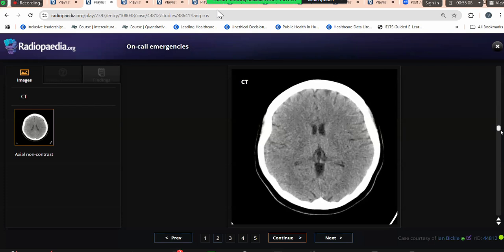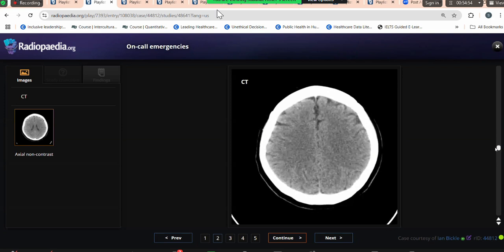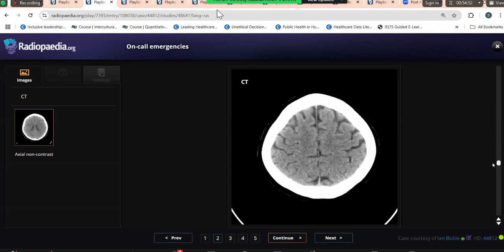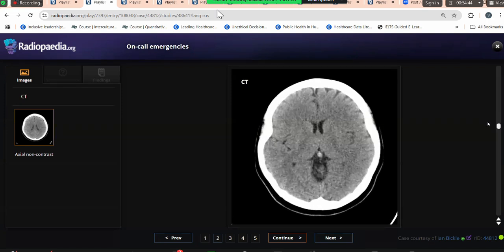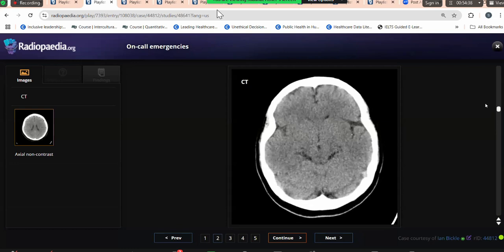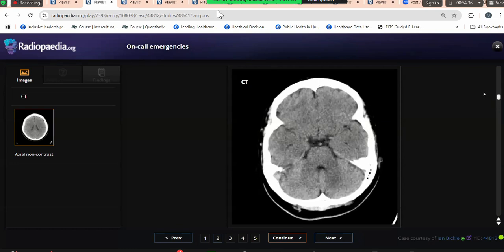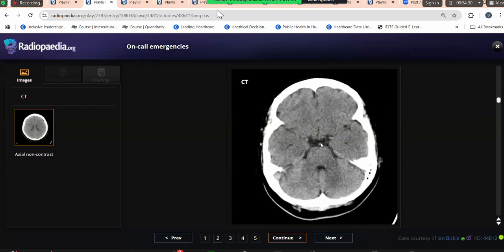Do you remember the history I gave you? The patient presented with neurological deficit and right-sided symptoms were there. Yes, good. So I'm now looking at my review areas. I could not appreciate any significant pathology in the first scroll. All the systems look unremarkable. I am still worried about this hyperdensity within the basilar artery.